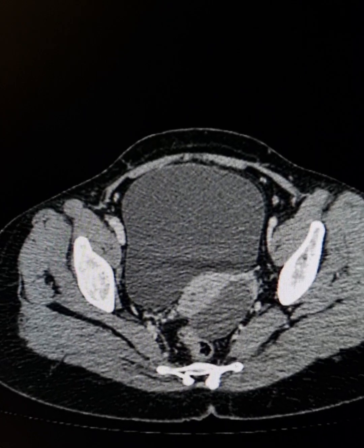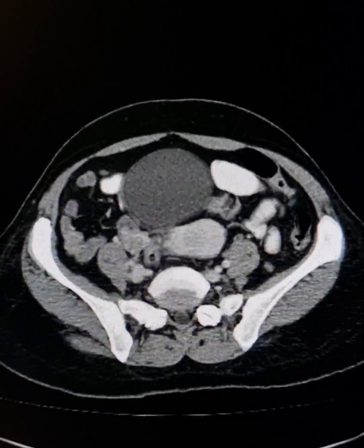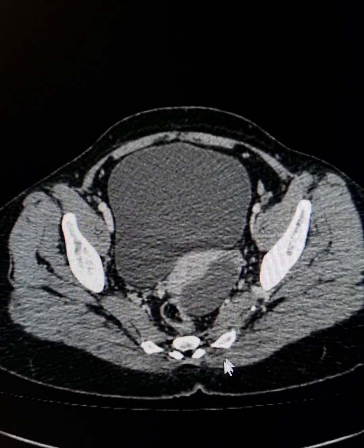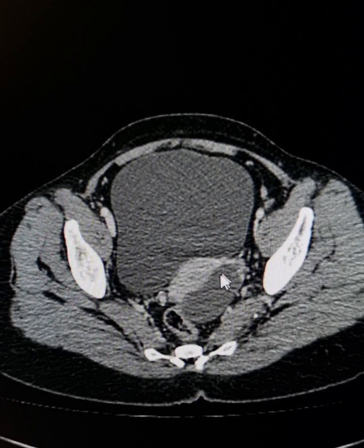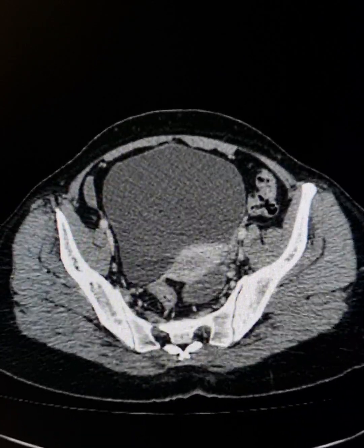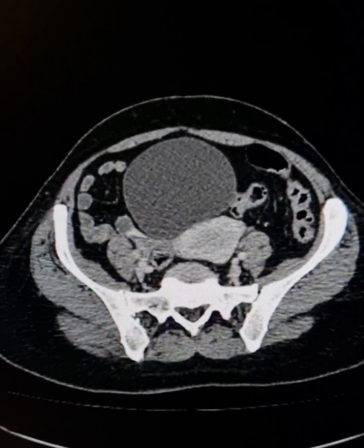If they have a bit of an irregular outline, then the chances are that they are peritoneal inclusion cysts or lymphoceles. They also do not have walls, but they don't have this much respect for integrity, and they don't maintain this sort of shape. The peritoneal inclusion cysts and the lymphoceles are post-operative findings, and they also don't have the walls.